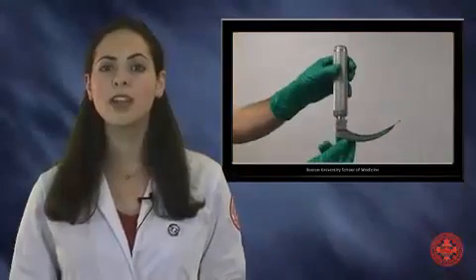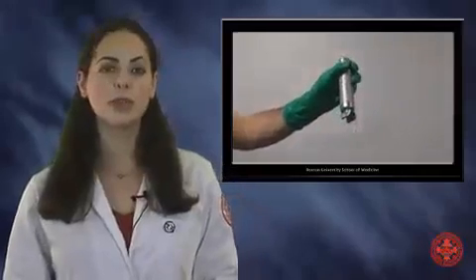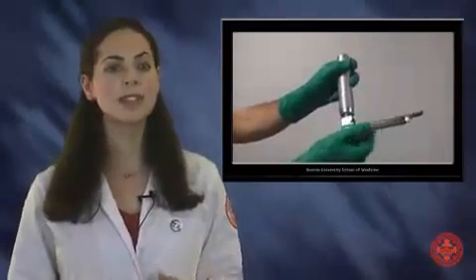Endotracheal intubation is achieved by exposing the glottis using a laryngoscope. The conventional laryngoscope is a left-handed instrument, most commonly fitted with the curved Macintosh blade. Laryngoscope blades are interchangeable, and anesthesiologists can choose from a broad selection of shapes and sizes to best expose the laryngeal structures.